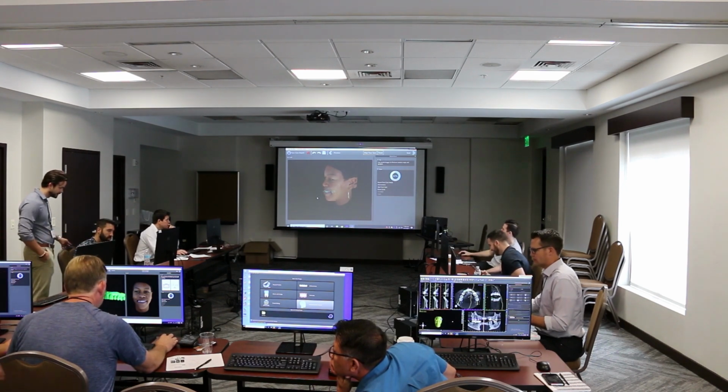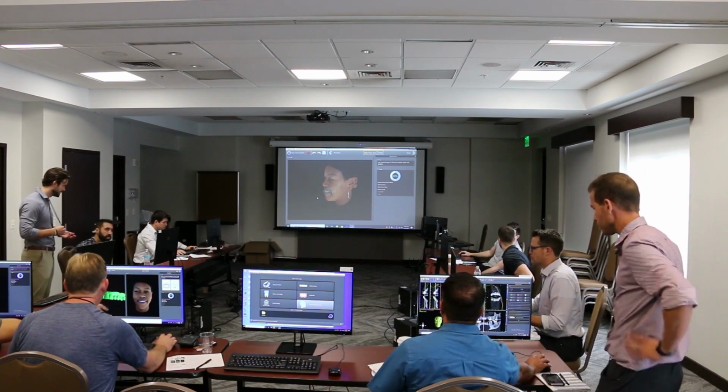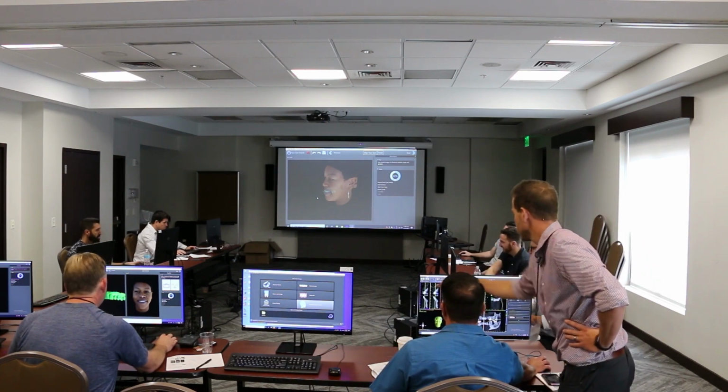Rotate into the face roughly. Get your files. Yeah, I got the file, but I clicked on the wrong one, I guess. Okay. And now let's go up to the front of her nose, right on the tip of the nose. Click on the tip of the nose.